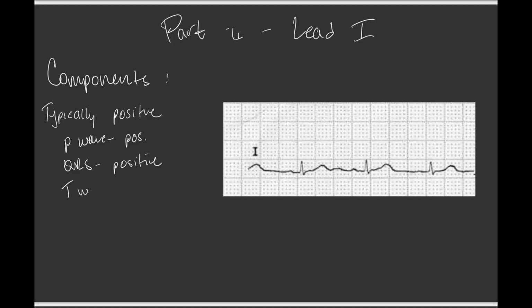And the T wave is positive above that baseline again. We'll see that in some instances, a small Q wave is present. But remember, because that QRS complex is net positive, the Q wave is usually never bigger than that R complex. And sometimes you might even see a small S wave.